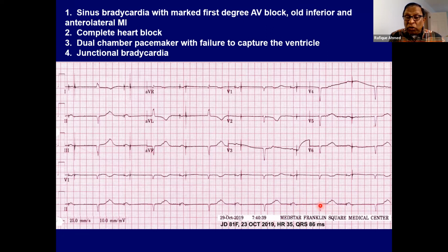Otherwise, you would have assumed if it were triggering from this, the atrial pacing would be after 1 second. But no, atrial pacing was earlier. It is a ventricular timed pacemaker. And the same thing can happen like VDD pacing or DVI pacing.